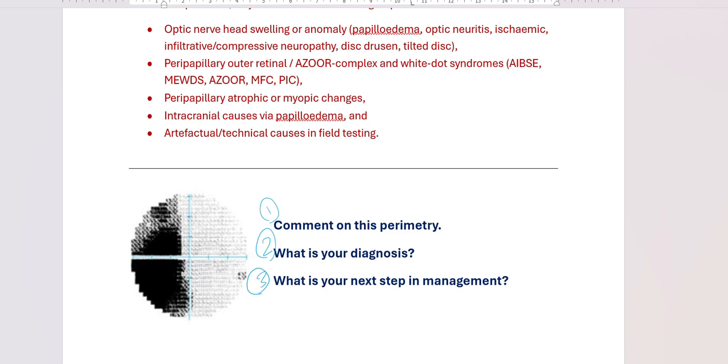All of you gave very clever and smart replies to these questions. So most of the candidates, when handed this display, assume that this is left homonymous hemianopia. And this is really not explained for me. Why did you assume that? During the viva exam, you're not supposed to answer. You're supposed to ask.